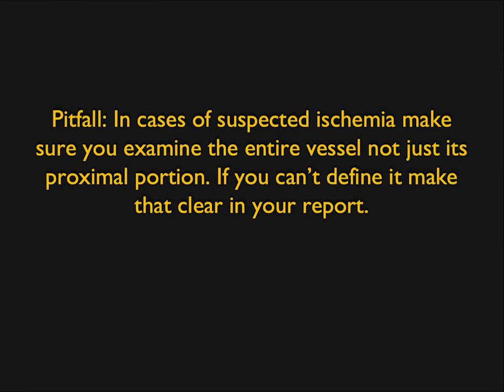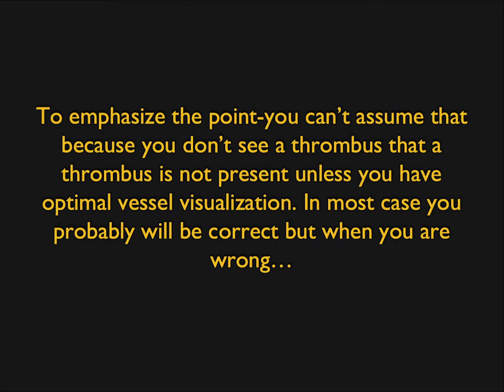And this is just to remind you, as I said a moment ago, you've got to look at the entire vessel, because you can see in the case I showed you, we always think clot's proximal. This is distal. What's distal? We're talking about really distal bowel. You need to look at everything, okay? You can't assume a thrombus is not there if you don't examine the bowel very, very carefully.